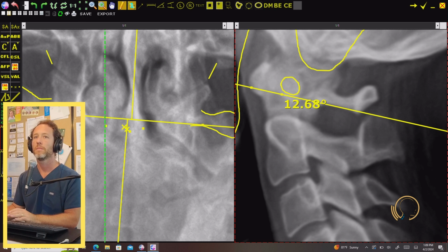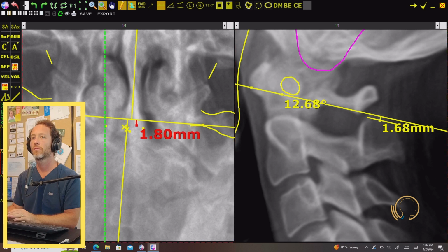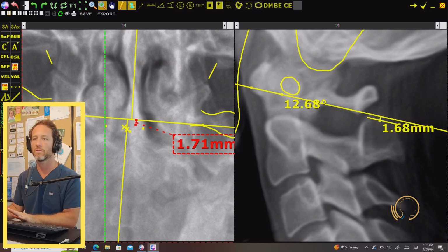Well, you can measure, let's say, just for example, to give a little bit of a gap, I can measure how far, and then that can translate over to that front view as well. And you can measure, see, I'm even off a little bit here on the one I did. You can get the same height when you're going to look for where that C2 spinous tip is. You should be able to dimensionally transpose in terms of height.